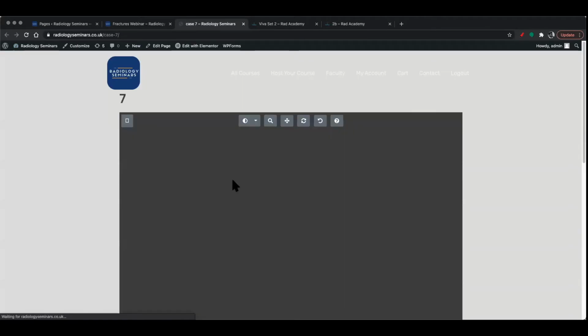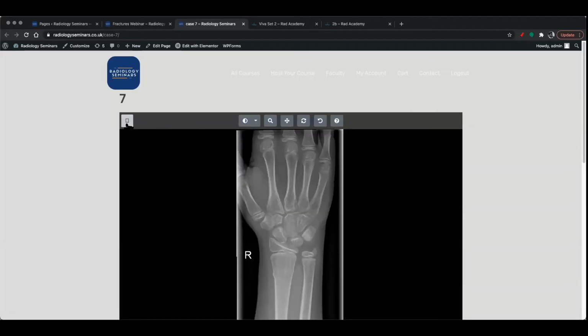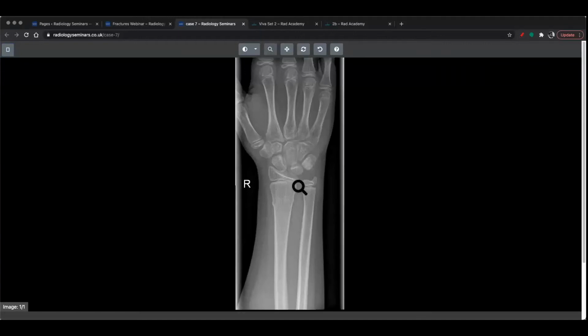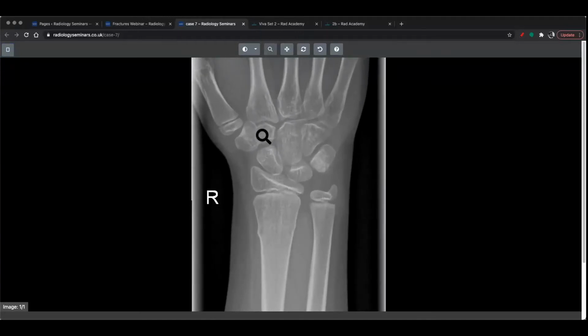Okay, we're going to get more and more interesting as we get along. Right, so Torus fractures. Peds don't fracture the way that other people fracture. As we get older, we get sharp definitive lines. Sometimes pediatric patients don't get sharp definitive lines. They get bends, like a piece of grass. When you're bending a twig or something like that, that's exactly what happens to them.